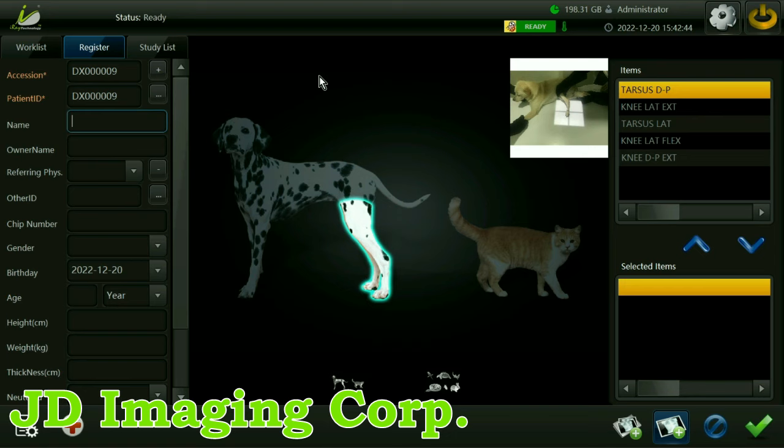The laptop, obviously, you can bring the images to your patients. There'll be a little bit longer acquisition time. They're not quite as fast as the desktops. And so let's get started here.